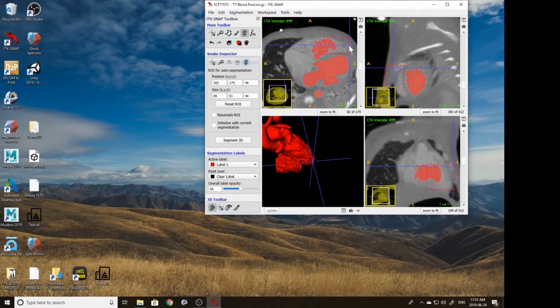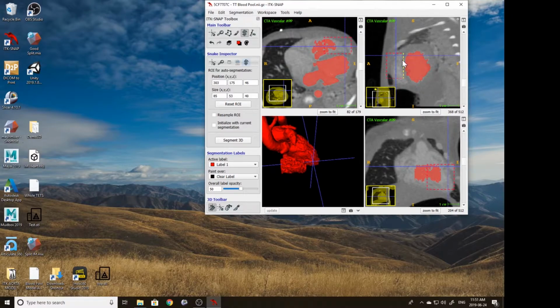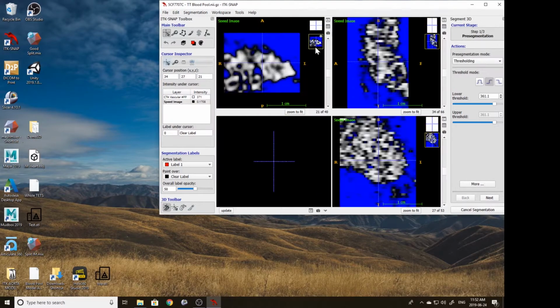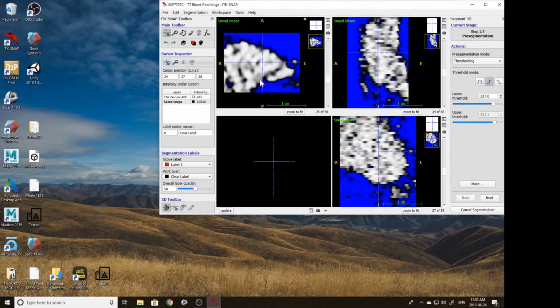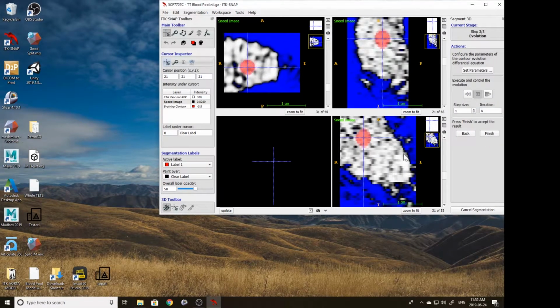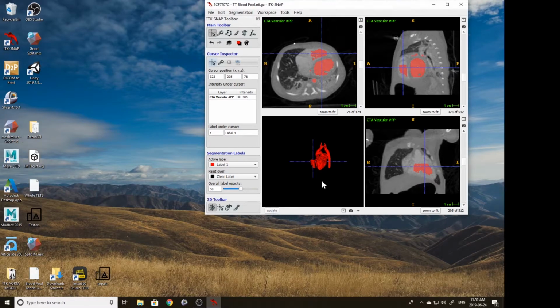So here I want to do a small segmentation so we're not getting the sternum or parts of the ribs. So I was just going through those different scans there to identify what different parts were, to make sure I am segmenting out what I want to segment. Perfect, pause and finish, update the model, and we're getting more and more of that ventricle.